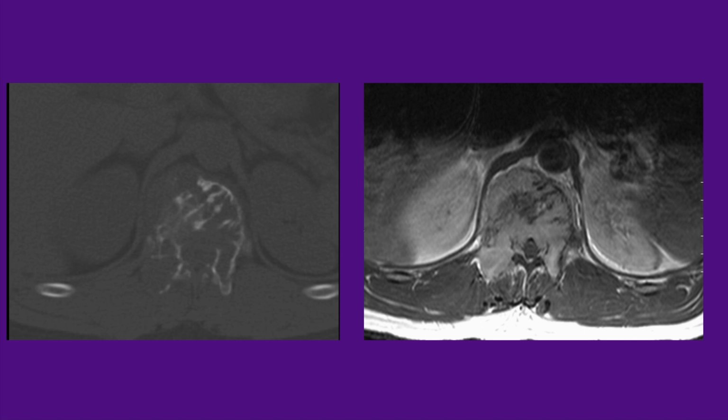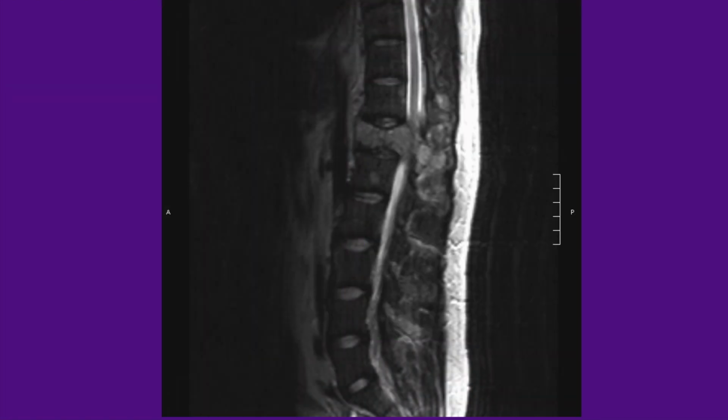Here, a solitary lytic lesion with preservation of some internal trabecula. Whenever I see something like this, I think about plasmacytoma, and this appearance on axial CT images has been likened to the brain. Here you see that patient with significant compression of the vertebral body and retropulsion of soft tissue mass into the canal.